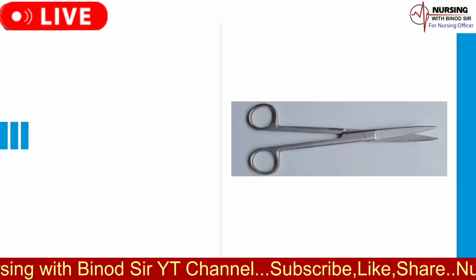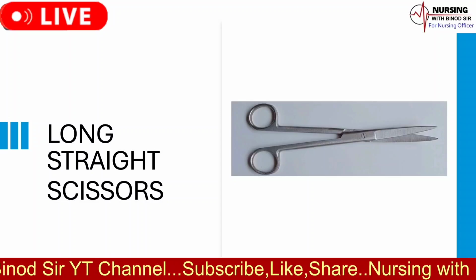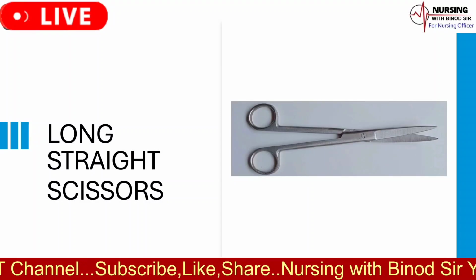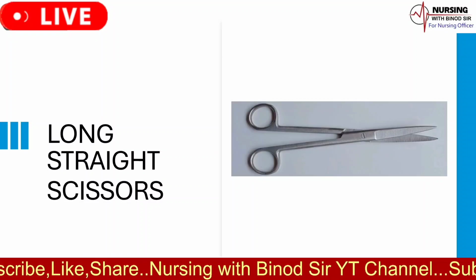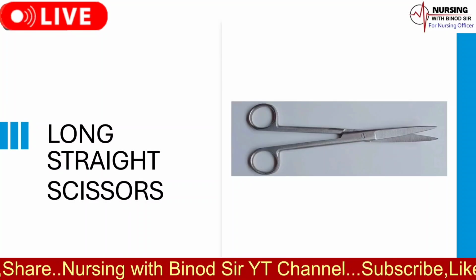The name of the instrument is long straight scissors. The uses of long straight scissors are as follows. 1. It is commonly used to cut the umbilical cord. 2. To make episiotomy. 3. To cut suture materials as in caesarean section.